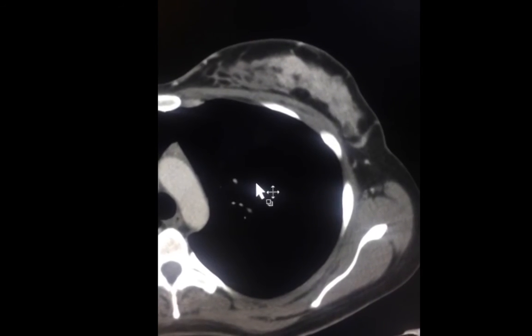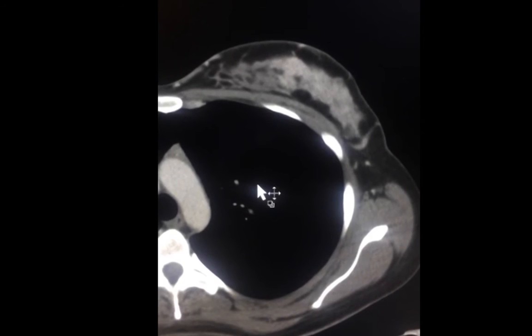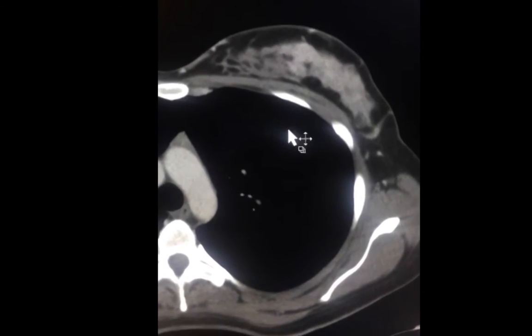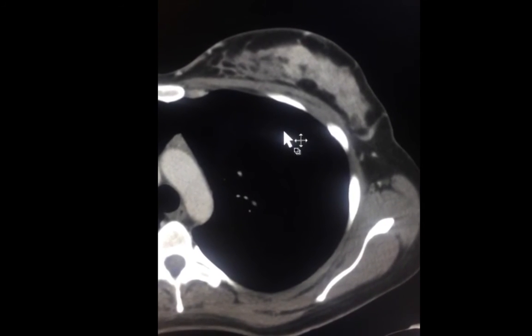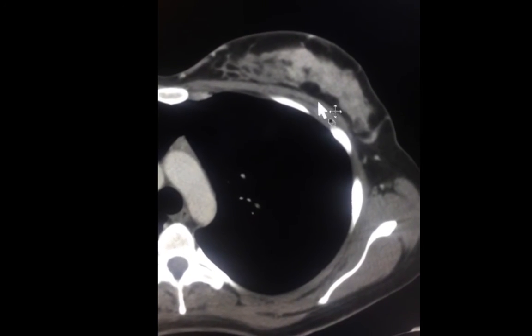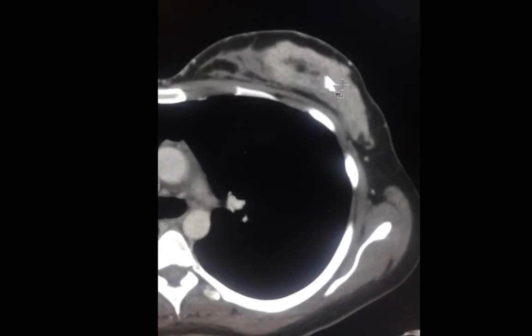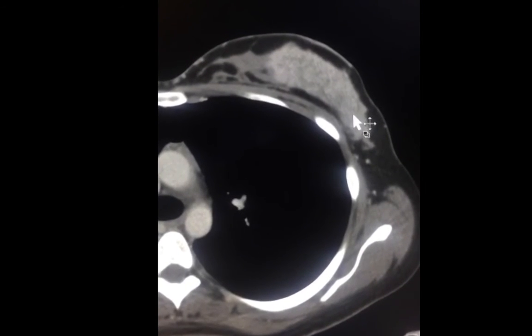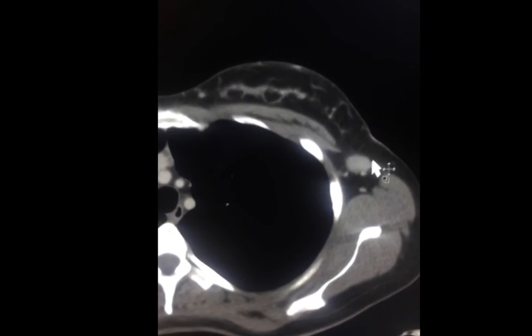It is important to remember that breast imaging is better performed by ultrasound, mammography, or MRI. Although CT scan of the chest is not the way to go for imaging breast lesions, such abnormalities should not be missed. The tissue diagnosis from this area turned out to be breast cancer, and these were positive lymph nodes.